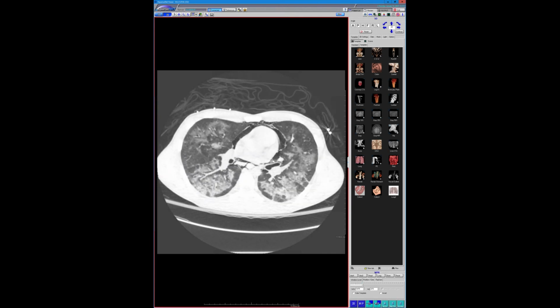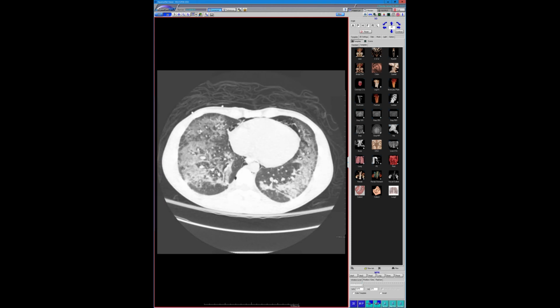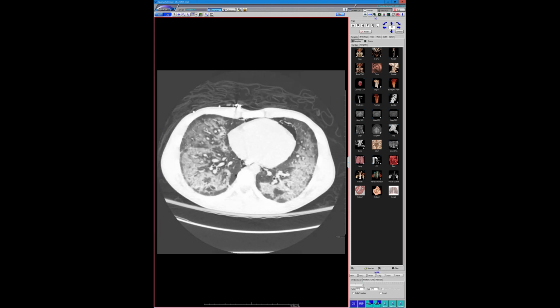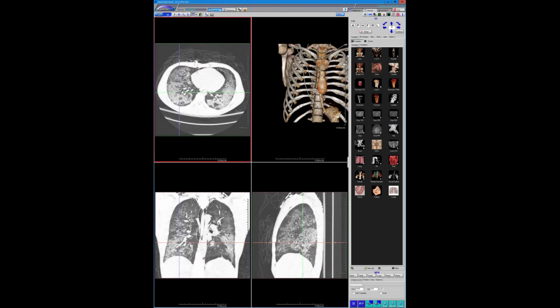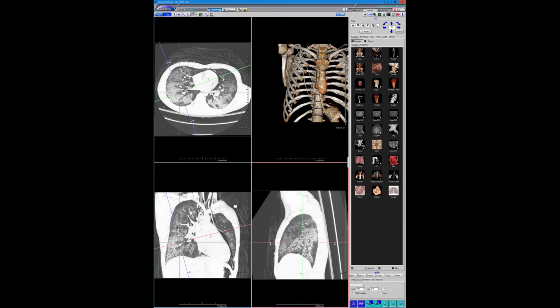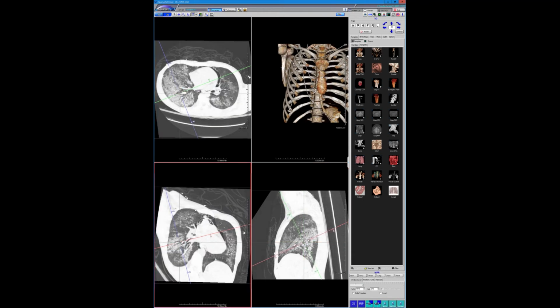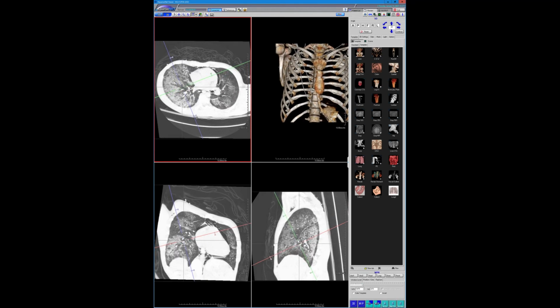This case I shared with some people. This is a young kid who came in with pneumomediastinum and a parenchymal abnormality, and was called COVID. He underwent some COVID tests, which were negative, but it was still thought to be COVID. They got a CT. It was read at night by one of our call people. It was called COVID, even though there are lots of features here that aren't good for COVID, a lot of centrilobular nodules, and then that beautiful sparing of the peribronchovascular interstitium.